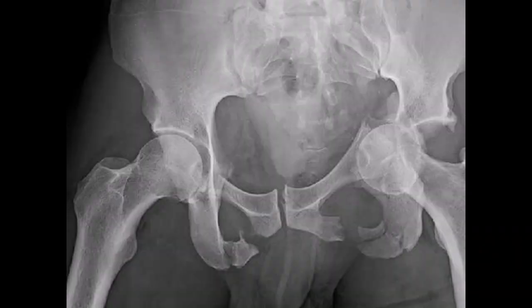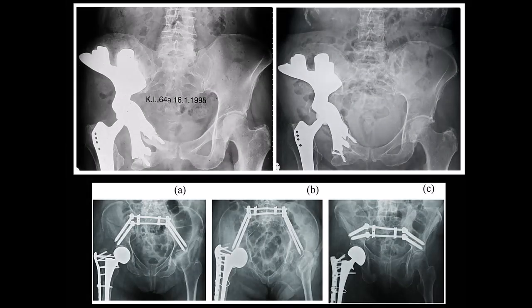Here we have a pelvic fracture with a dislocated hip, and this patient will probably be going to surgery. So how do we move the patient without destroying some of the tissues that surround these areas that are fractured? And what will the patient have done to them in surgery? Well, let's take a look and see what we can find. These demonstrate post-surgical fixtures that are put into the pelvis to stabilize it after the fracture.